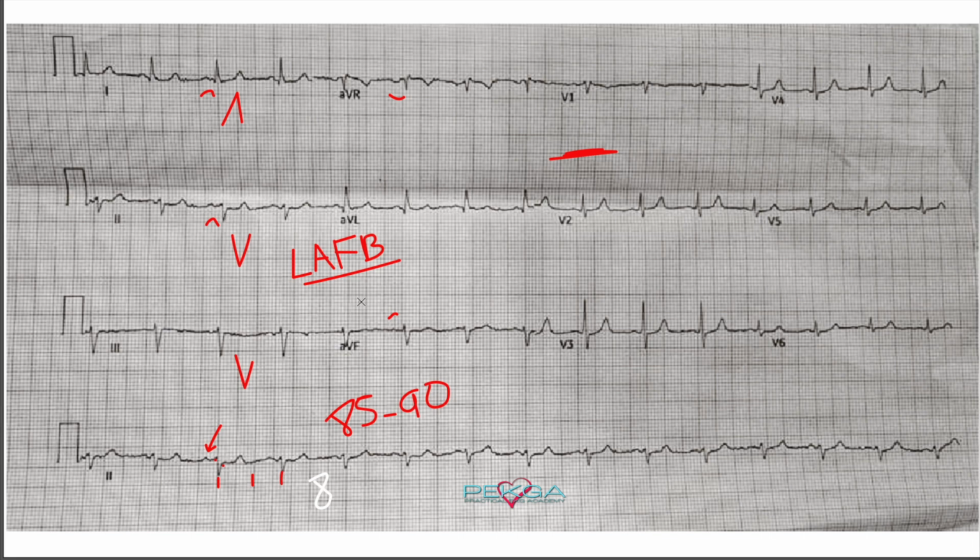So that's what's going on here. However, at a higher rate, this fascicle is able to function properly, quote unquote, right? Again, I'll be going into this a little bit further in the expanded video, in the deep dive video. So feel free to check that out.